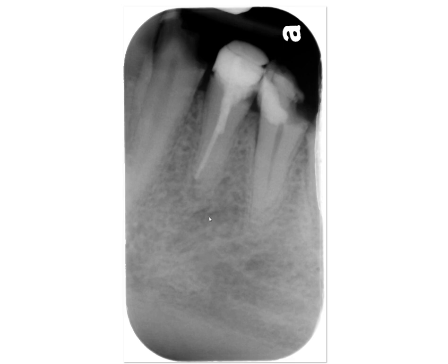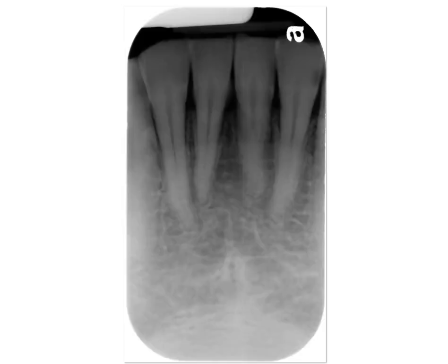We would really have to look at another view of this area to have more confidence of the anatomic landmarks. But based on my experience, yeah, it could be this one, but I won't go into that too much more because a 2D image is always a little limited.